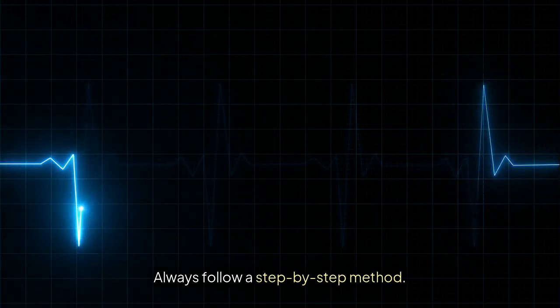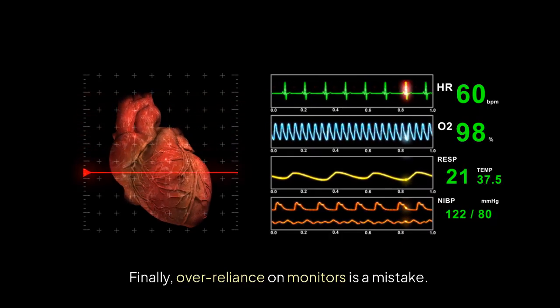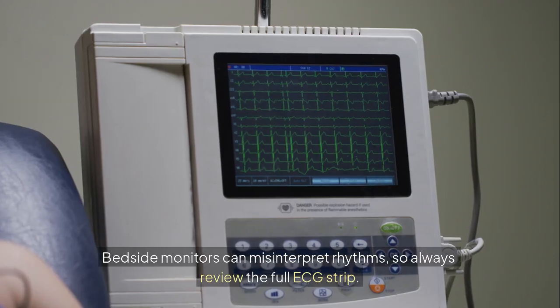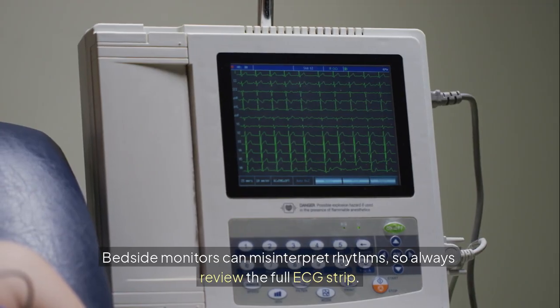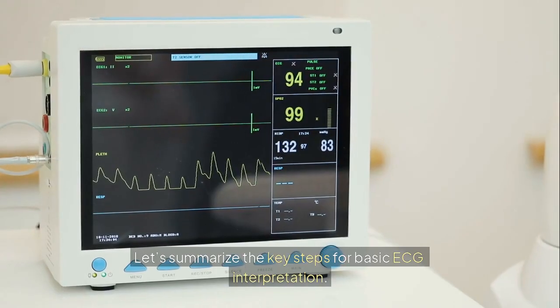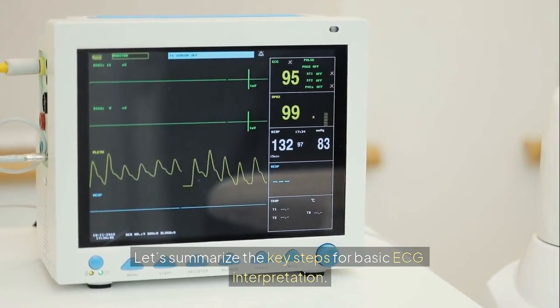Always follow a step-by-step method. Finally, over-reliance on monitors is a mistake. Bedside monitors can misinterpret rhythms, so always review the full ECG strip. Let's summarize the key steps for basic ECG interpretation.